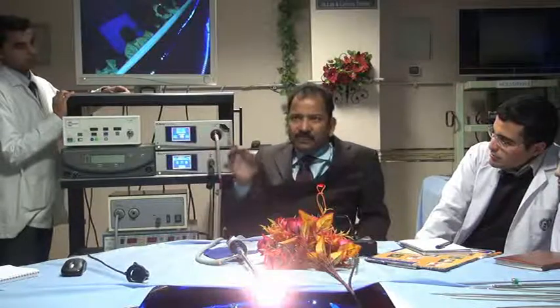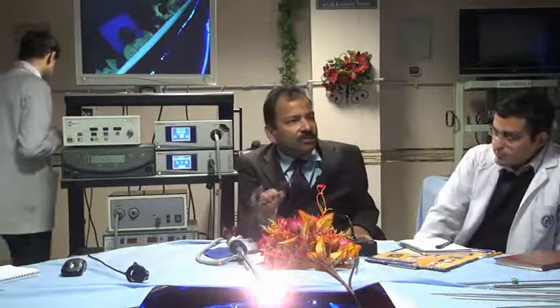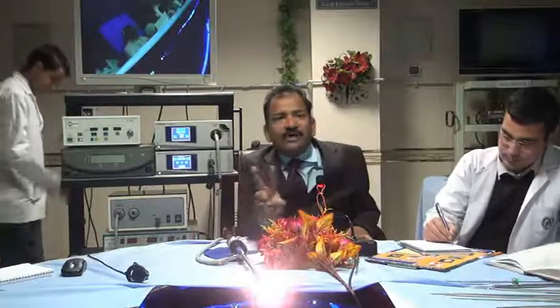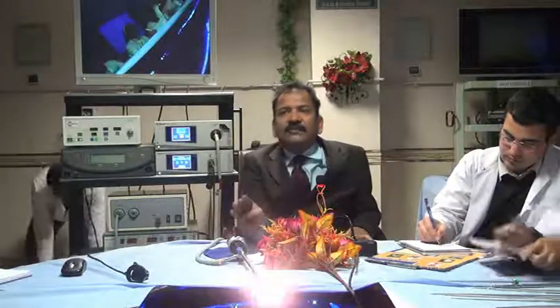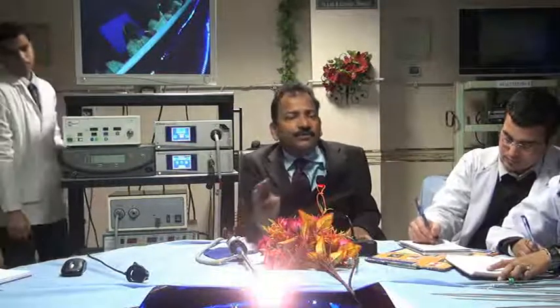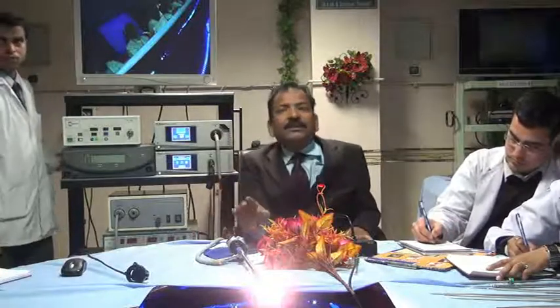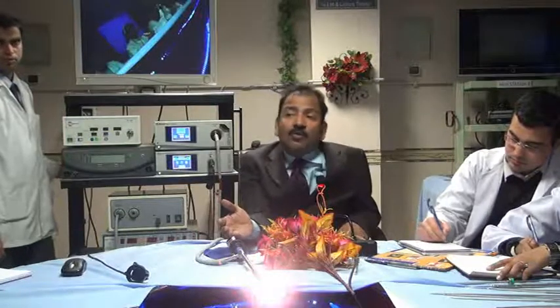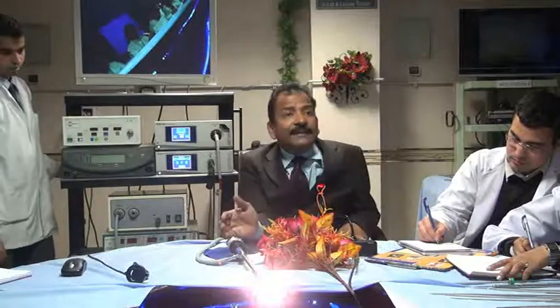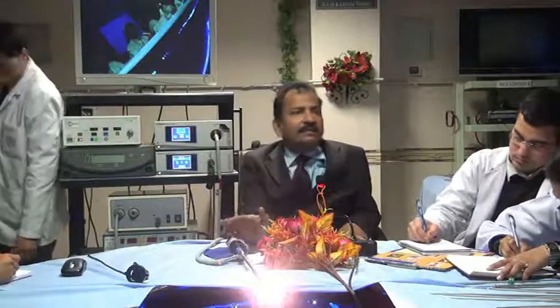Now briefly, just within 2 minutes, I will discuss the light source. Light is one of the very important modus operandi. Light should have two properties. One is intensity, another is color temperature. Intensity of the light ideally in laparoscopy should be 250 watts. If it is more than 400, it will do what? Glare. And if it is less than 150, it won't show you well. 250 is optimum.